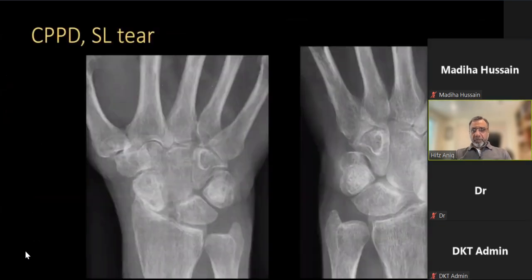Very good question. Okay. Lunate dislocation will not occur in chronic cases. It will always be trauma. Number two, these changes here, although it looks funny because it's widened and dislocated medially, the alignment of the joint looks funny. Of course, I didn't show you the lateral.